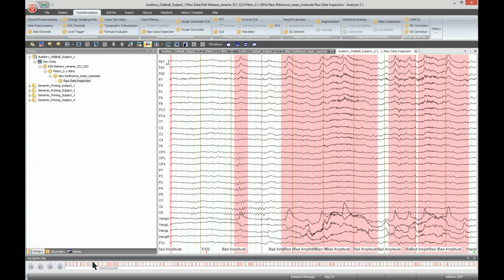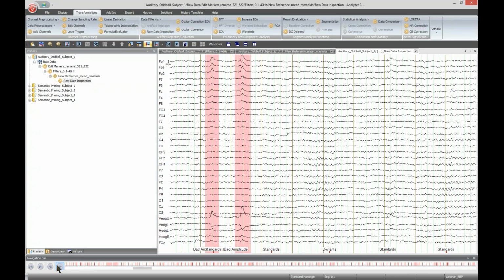This data is still there, but following transformations respect these portions and will not use them if the computation is not carried out individually for each data point. So if the data point would influence other data points. At this stage, the bad intervals won't be discarded, because if you would cut out the bad intervals, the data would jump at those time points and the continuous flow would be disrupted. Let's scroll through the data now once more.